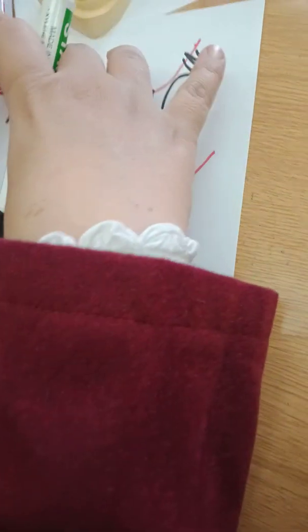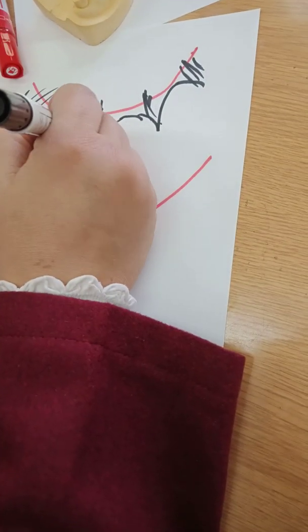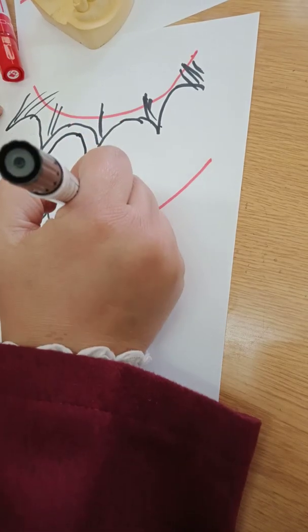Okay, this is our lump of material. We added it here, okay? And now we're looking at it facially. It was a block. This is the impression that we took. Yes, these are the teeth. The actual teeth are here. Suppose the actual teeth are here.